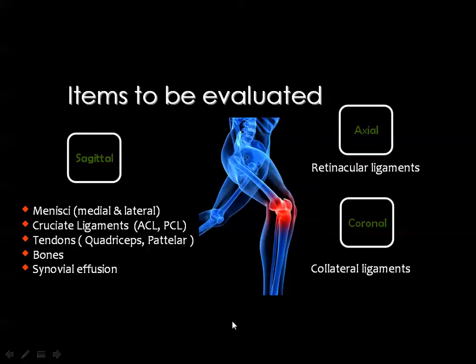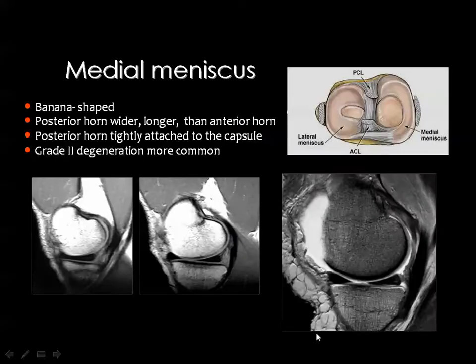And the last one, the T2, can be replaced by the sagittal gradient, or T2 star images. In the axial images, we have the T2 axial images, and in the coronal, we can have the gradient or the STIR or both sequences for coronal images. Then we'll start the anatomy, and we'll start with the menisci.